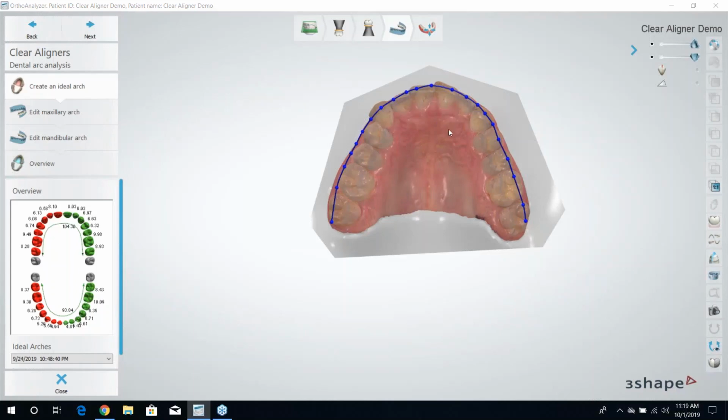because you've started moving these all over the place. Things don't look the same as when you started, and you lose that imaginary visual guide. So this gives you a concrete visual guide that you can use. But again, this does not lock any of your tooth movements. It doesn't prevent you from moving these in any direction. It's simply a visual guide.